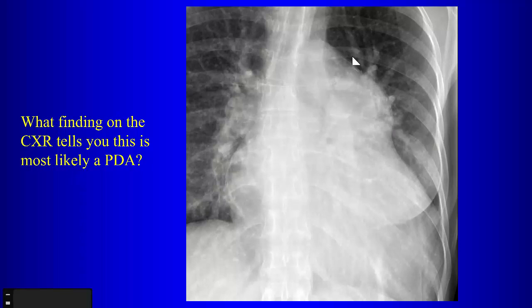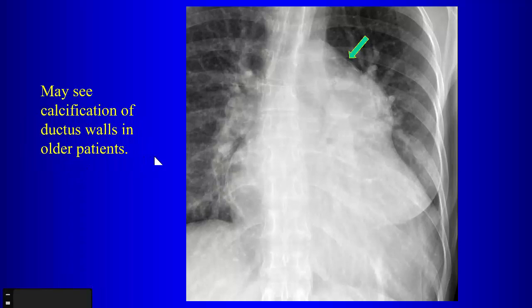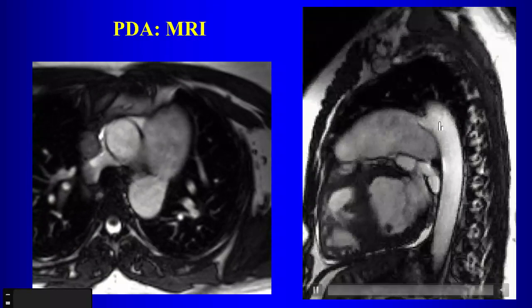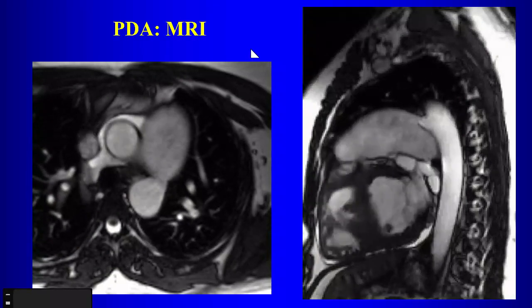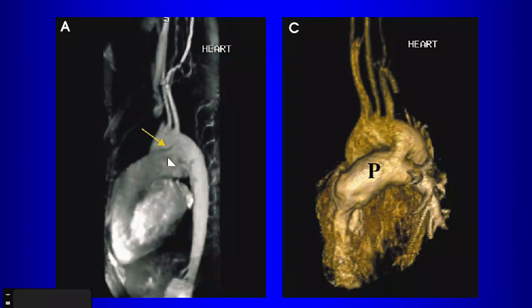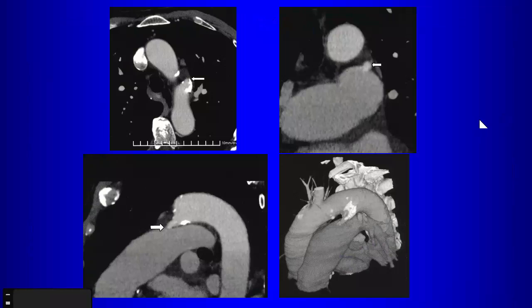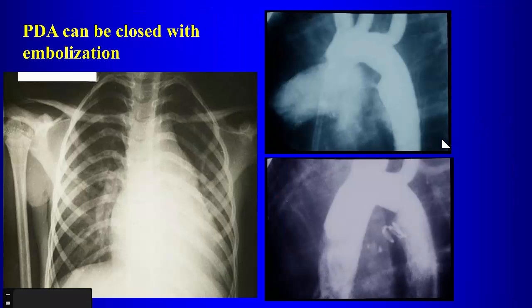But if you have overcirculation and you see calcification there on the plain film, then we are thinking of patent ductus arteriosus in the adult patient. There it is on MR, very easy to demonstrate on MR with PDAs, okay? Pretty easy to demonstrate on imaging. Here we saw this example, very easy to show. And again, it's common for adults to have calcification of PDAs. So look carefully at that if you notice it.